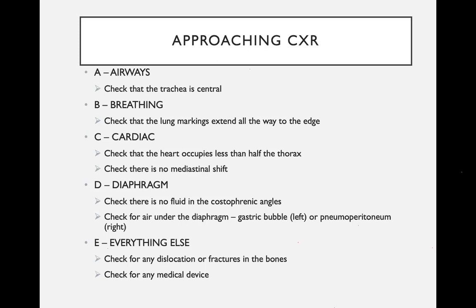And also you look at if there's any white markings or white shadow. In medical terms, we call a white shadow an opacity or opacification. So when you see any white shadows in the lungs, you say, for example, I can see some opacification in the left lung or the right lung, as we will go through in a second.